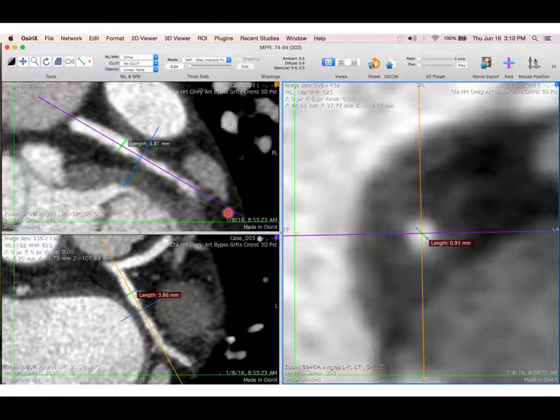Anyway, determining when you stent a vessel based on the CT. Obviously now, with CT, we've cut multiple planes through the vessel at angles, so that we're running right along the vessel at a location where we have this stenosis. So you can see the vessel's probably 4 millimeters. It reduces down here to probably 2 millimeters, and then goes back up. Again, here it comes down to maybe 2 millimeters, and then goes back up.